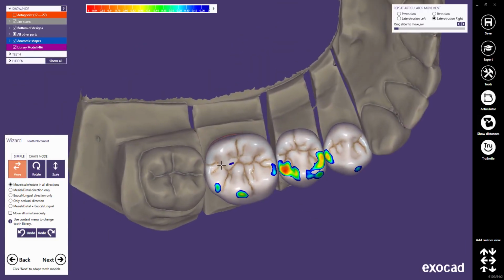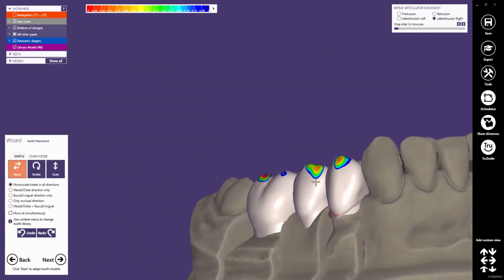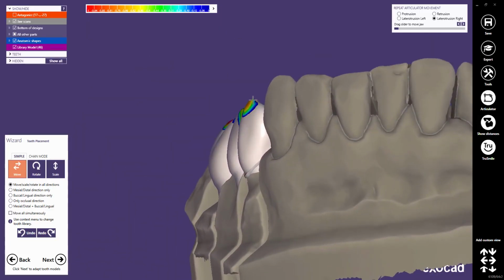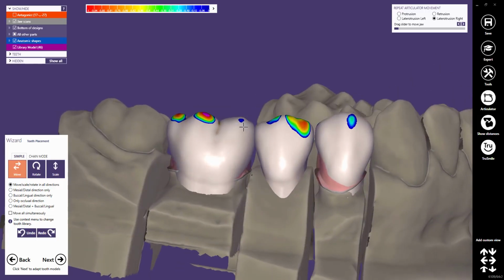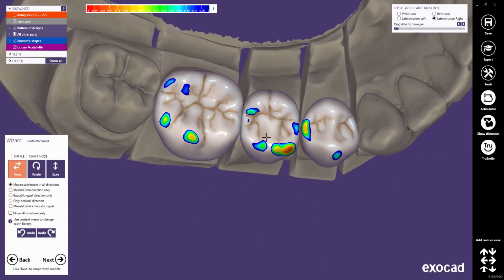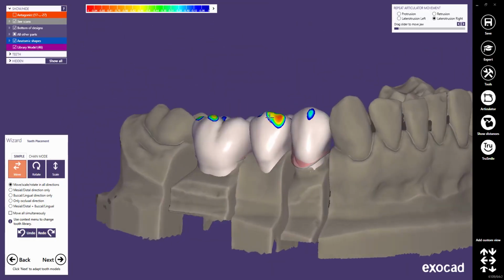Usually I set the view from the top to start placing the teeth in a line. Then I move to the frontal view to modify the tooth axes. Then I move the jaw to the side view for adjusting the tooth height position and the curve of Spee. Normally I hide the antagonist during the initial placement. I think the colored contact intrusions are enough, as I'm not too critical with the occlusion now.